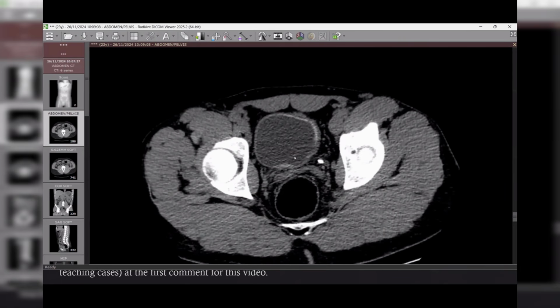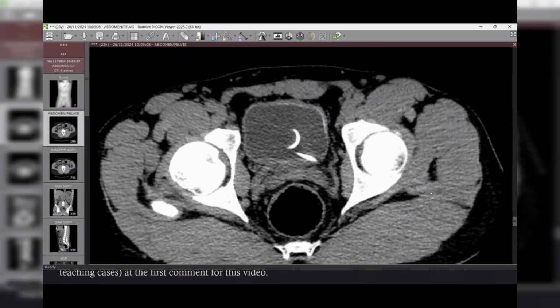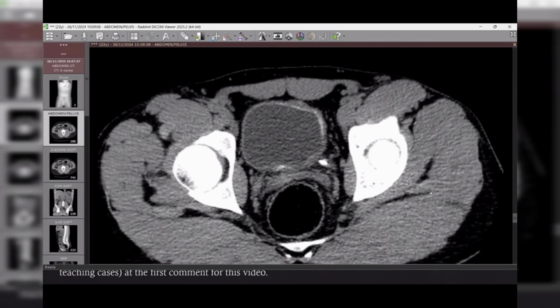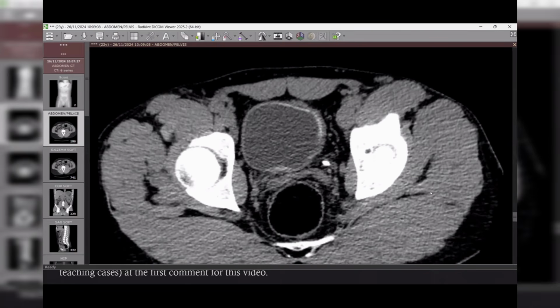Yes, there is mural thickening with subtle hyperdensity. I'm thinking that there is likely calcification of the bladder wall with thickening. Very good. Bladder wall calcification mostly occurs in patients with a history of schistosomiasis infection. Our top differential diagnosis in this case is schistosomiasis or bilharzial calcifications.